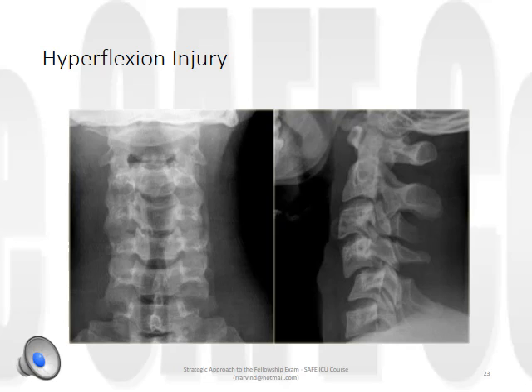If you come to the AP view, on first gross inspection it doesn't look so terrible, but if we're following our systematic approach and we come to look for each spinous process, we can't see some of them and we realise that they're actually grossly malaligned. They're sticking out to the right side of the patient, which is the direction in which the rotation has occurred.